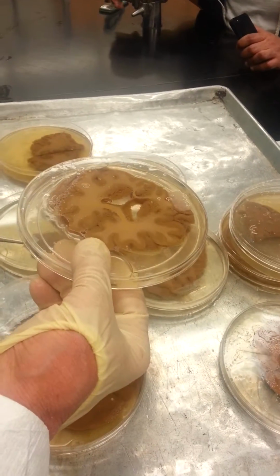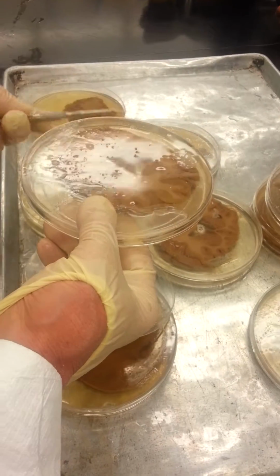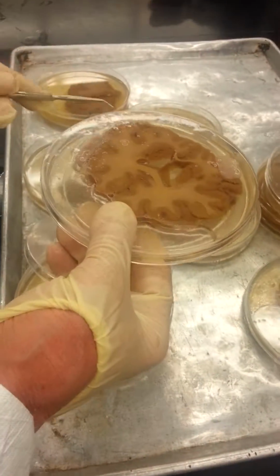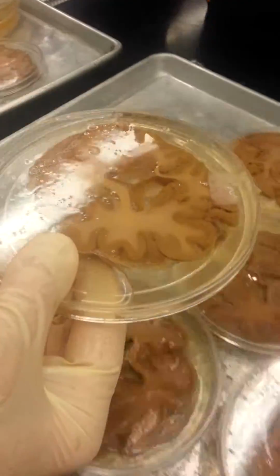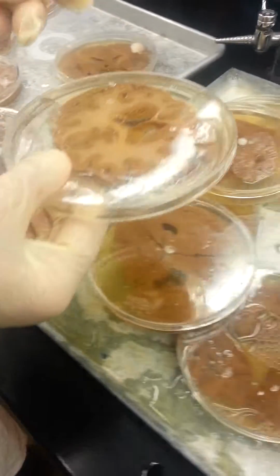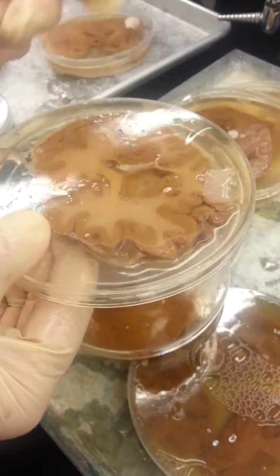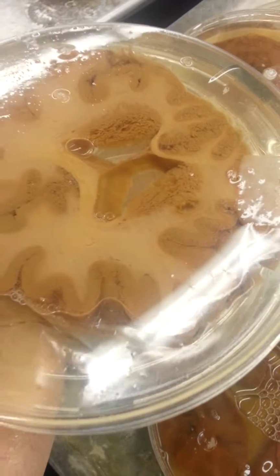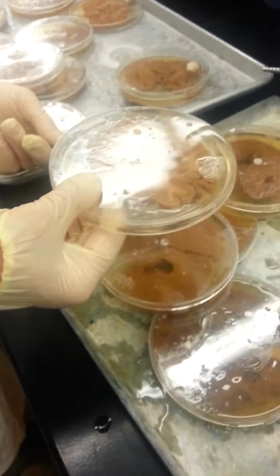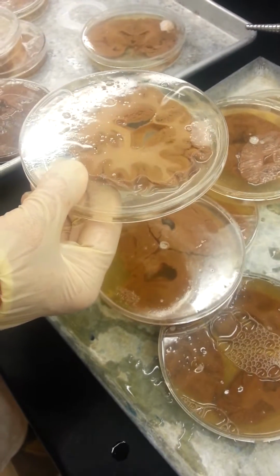That's not a bad answer though, because since you only see a little bit of putamen, you can infer that the other side's going to show more, which it does. Can we say that? Yeah. So it is true that there's something more obscure, but something less obscure is that you just see a little bit of putamen there, so you can infer that the other side's going to show more putamen. Okay. Can we say that that's the first slice that shows putamen? That's how we know.